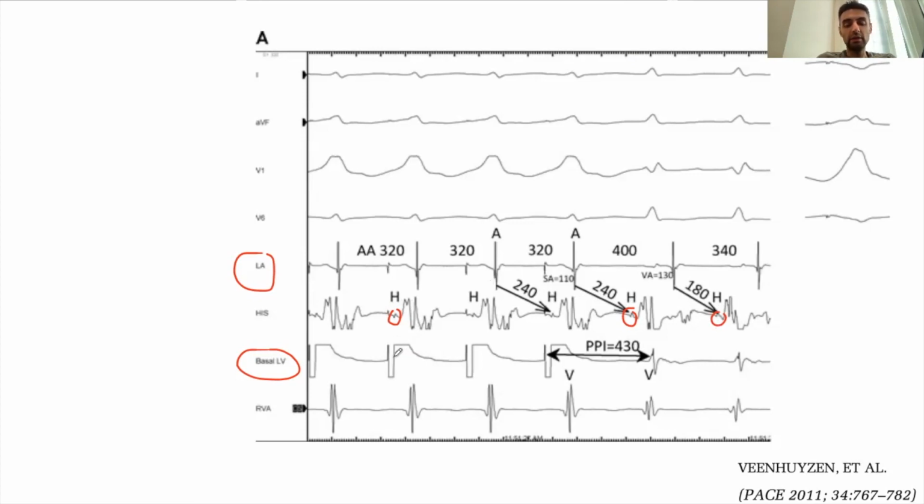So you're V pacing. The earliest A, so this is, by the way, your A, because this is a clean A, this is how it looks like, and this is your V, complex V. So VA, earliest A is at your LA. VA, VA, and then VA, AH, VA, and then you stop pacing and the tachycardia continues, AHV, and then VAAHV. Okay, so the earliest A, like we said, is in the LA. When you stop pacing, the tachycardia went back to the baseline cycle length at 340.